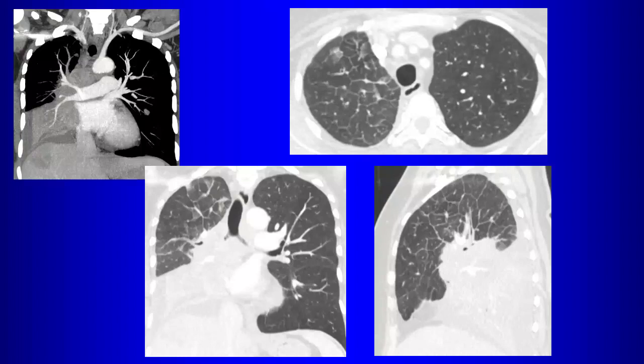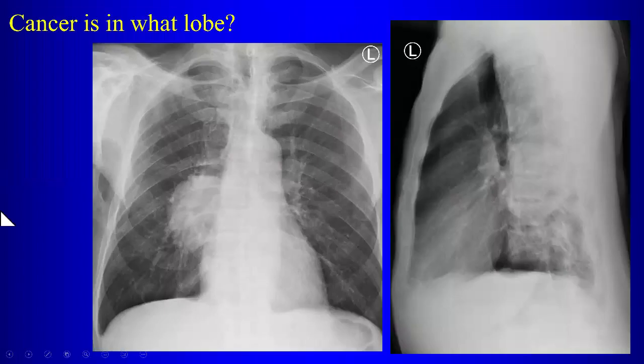But what goes against this being lymphangitic carcinomatosis? It's very smooth. So here you have smooth interlobular septal thickening, and then we mentioned, what did we say? Yeah, it's interstitial edema. Remember, this patient has obstruction of the right upper lobe pulmonary vein by the tumor. So localized areas of smooth interlobular septal thickening in patients with cancer are not always, certainly lymphangitic carcinomatosis is something to consider, but it's not always lymphangitic carcinomatosis. It can be interstitial edema from obstruction of the pulmonary vein, okay?